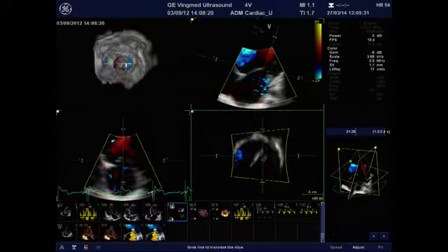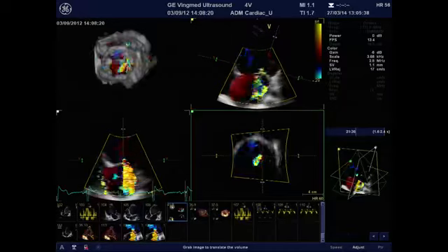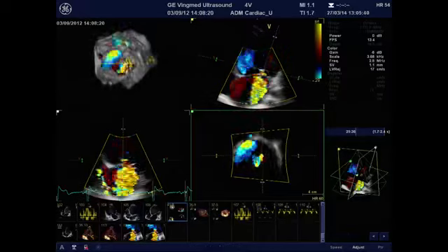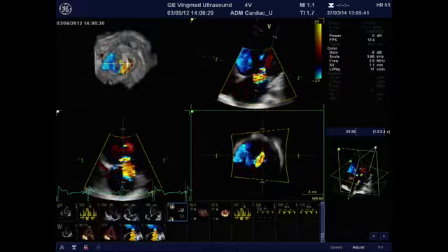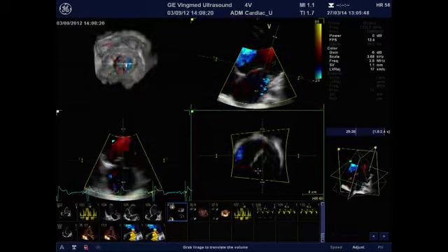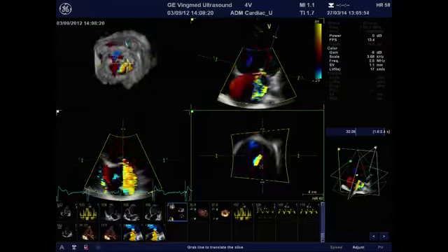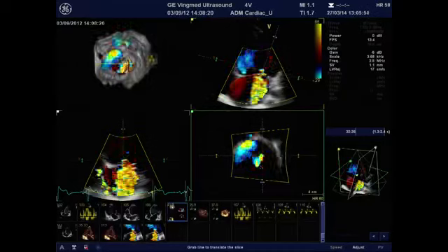This is the regurgitant flow at the level of the regurgitant orifice, and you have the shape. So this means that it's the real vena contracta, and if you measure it, you will have the vena contracta area. And if you look at the geometry and the shape, it appears completely elongated, not round at all, as you assume that the regurgitant orifice is purely circular.